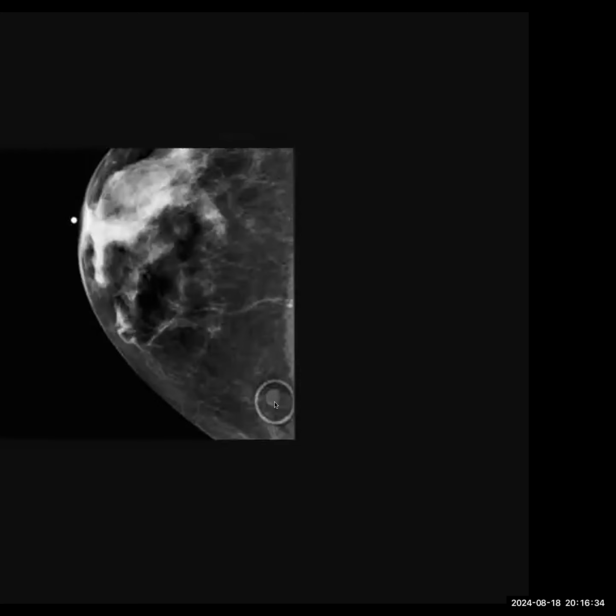What would you like to do next? I would want to see the contralateral breast if the same marker is present. That was normal. No, it was only present in this breast. And the physician wants to know, is this concerning or not? Is there anything else you want to add? No, there's a slight asymmetry in the breast tissue in the lateral quadrant as compared to the medial quadrant. Okay. Sure. Let's go to the next case.